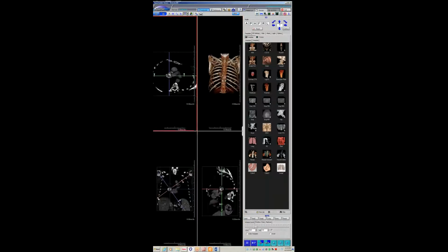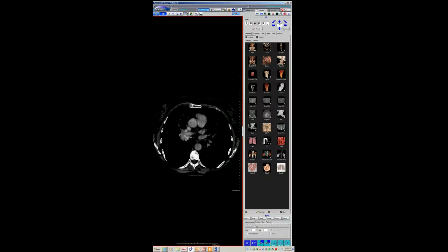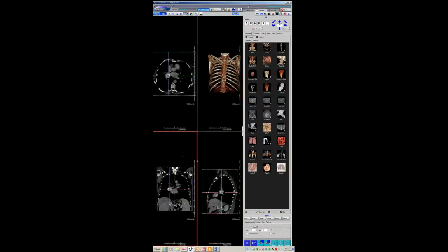It's not a benign pattern, but more of that sort of stippled pattern, whatever you want to call it. Yeah, 100% that's calcium. But a lot of the other areas are as bright as the aorta, or brighter than the aorta here in the pulmonary artery on this portal venous phase study, which is another good clue for a carcinoid. So that's just one of the bigger carcinoids I've come across.